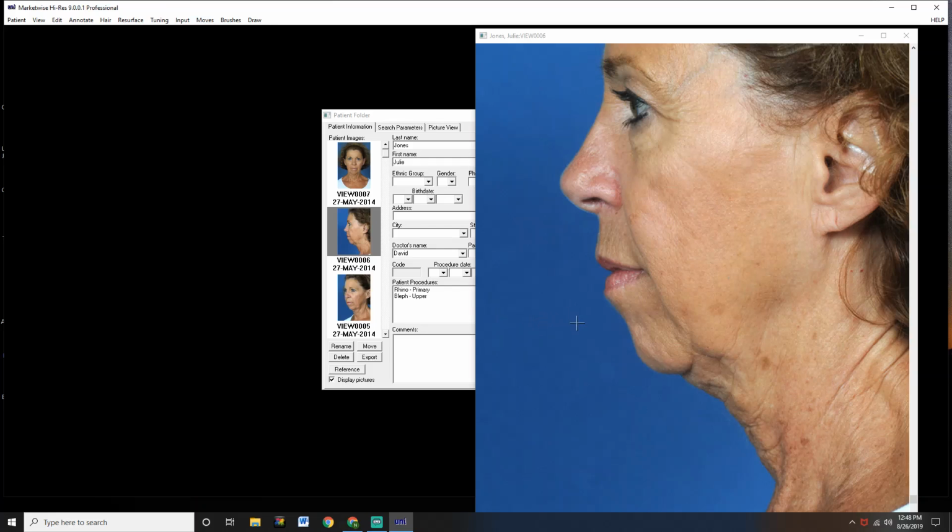Now I'm going to go over to my patient picture, and what I want to do is grab an area that is the area that I want to pull out. I want to be careful not to put things in the box that I don't want to pull out to demonstrate the chin implant. So I'm going to make my box and include a lot of the blue. I'm going to click down, pull my box over, and include just this area in my box.